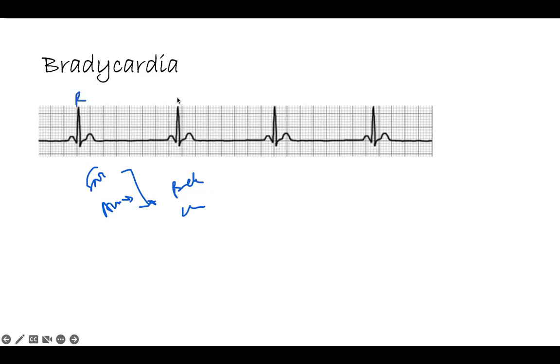You look for your RR and see if the rhythm is regular, and it looks like it's regular. Okay, then I see a PQRS, PQRS, PQRS, PQRS. Then you say, oh, okay, how much is the QRS? It's almost 2 boxes. And this is like 3 boxes. So 2, 3 boxes, look, PR interval normal, QRS interval also normal. Then I calculate the rate between RR. I did not tell you this is 6 seconds. If this were to be 6 seconds, you just calculate, you count 1, 2, 3, 4.